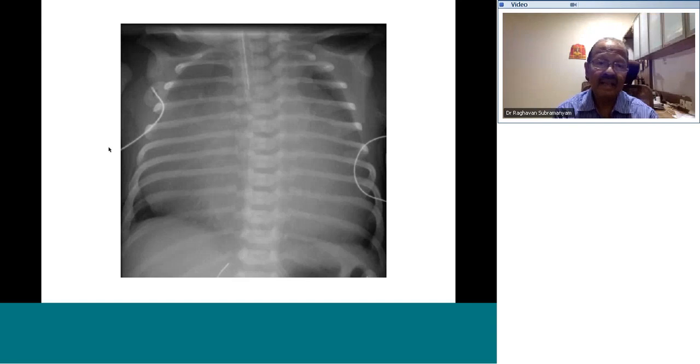This is massive cardiac enlargement. Again, the right atrium is touching the right chest, and the left side of the heart is touching the left chest. So the cardiothoracic ratio is 100%. Therefore, with massive cardiomegaly, you have to talk of differential diagnosis. One diagnosis is neonatal Ebstein. Sakshi, you are right. Neonatal Ebstein, huge, massive RA enlargement.